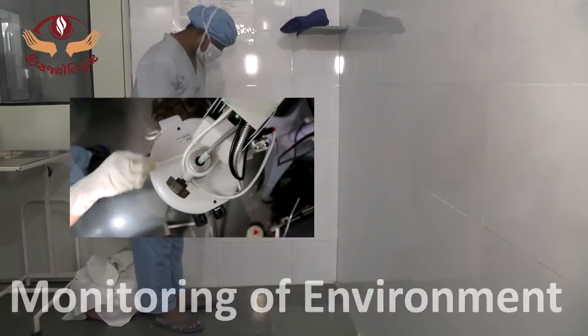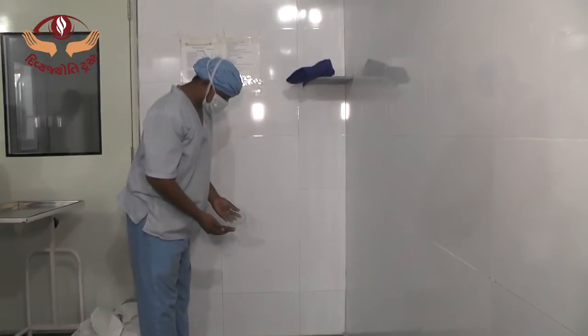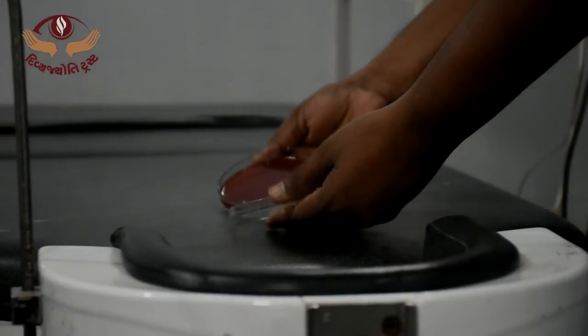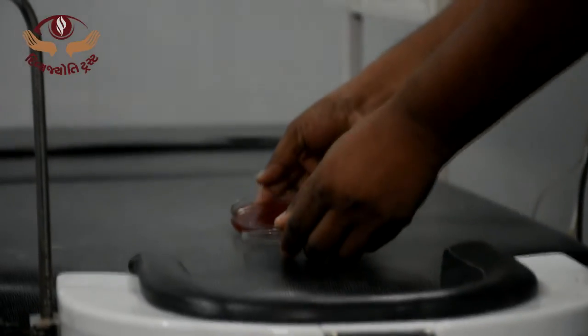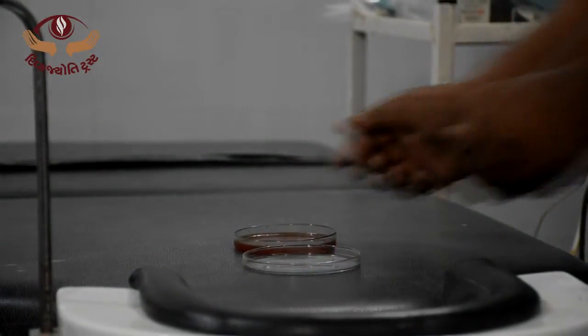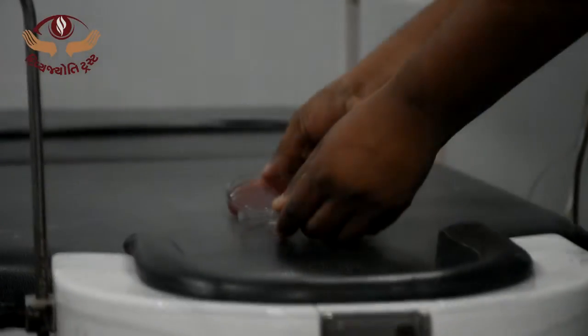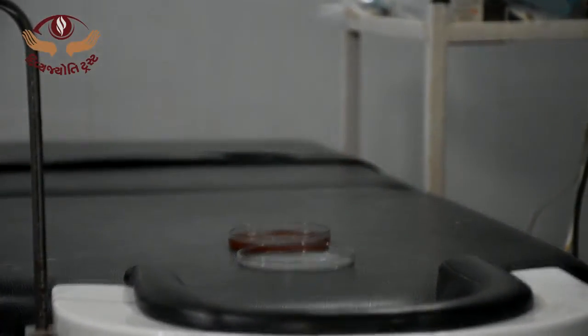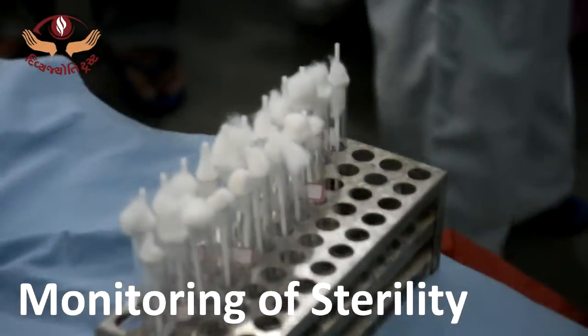Monitoring. Monitoring environment. The bacterial carrying particle load in theatre is checked by the sedimentation plating technique every fortnight. Alternatively, bacterial counters are also available but costly. A new technique to detect bacterial DNA, which gives immediate results, is also available now, but again, it is costly. Monitoring of sterility.